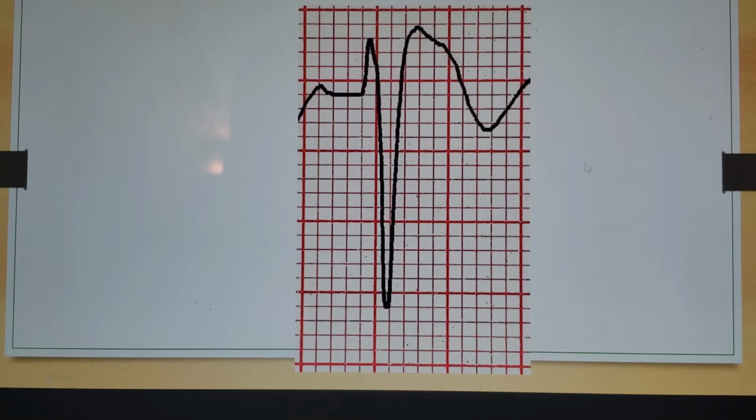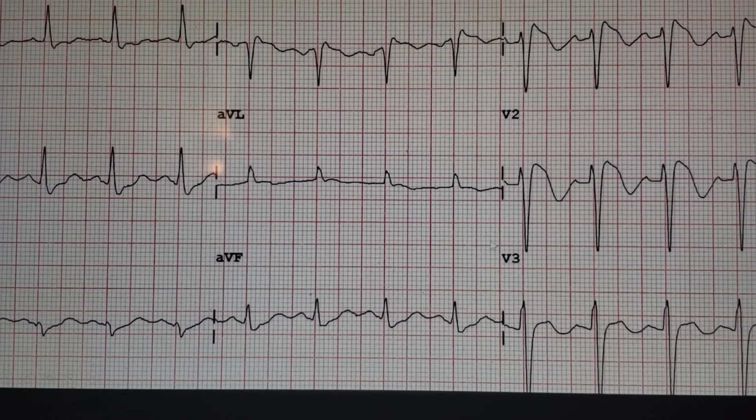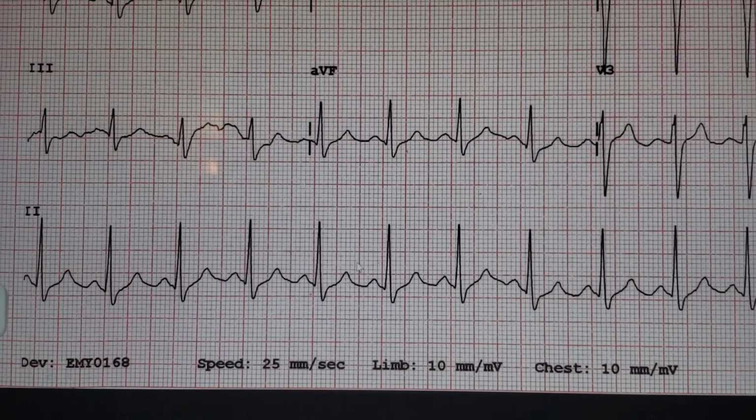So right there, when you call saddleback, right? So you've got one side of the saddle, the other side of the saddle, and this deep thing here. So saddleback. Here's another one, saddleback, right? And V1, V2, up, down, up, down, up. So just remember Brugada, saddleback. Same thing. So this is the other form of Brugada where you have it kind of up, and then see how it kind of, you got a ST elevation and then over.